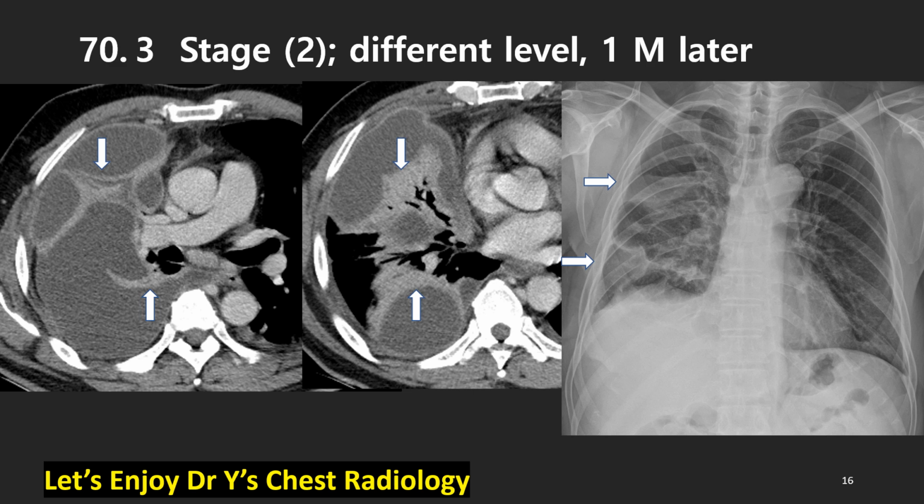These two images show us beautiful but actually ugly multi-pocketed, multiloculated, thick pleural enhancement, progressed, complicated stage of parapneumonic effusion.